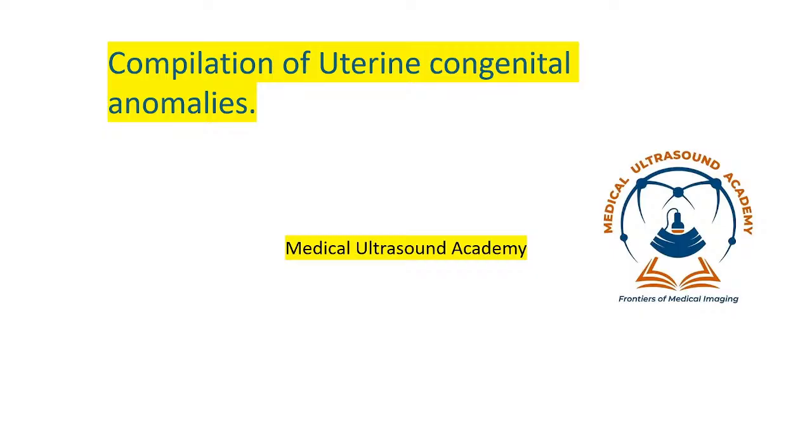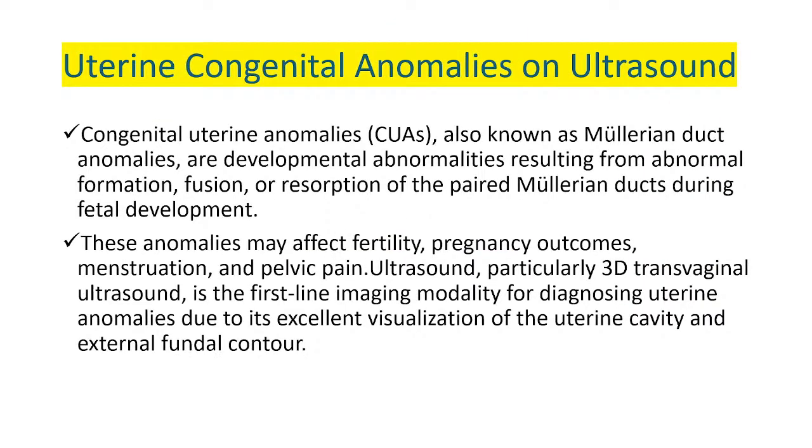So in this presentation, I am going to talk about a compilation of uterine congenital anomalies. By the way, my name is Last. So, uterine congenital anomalies on ultrasound.